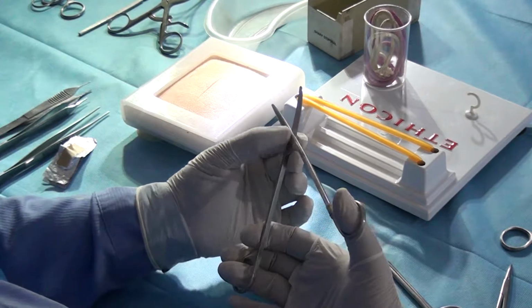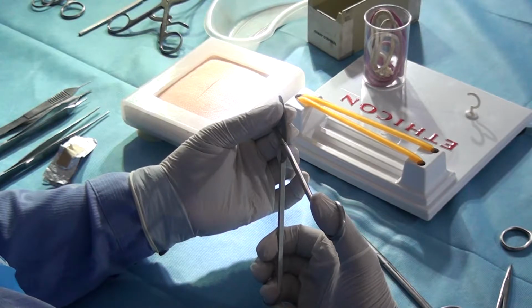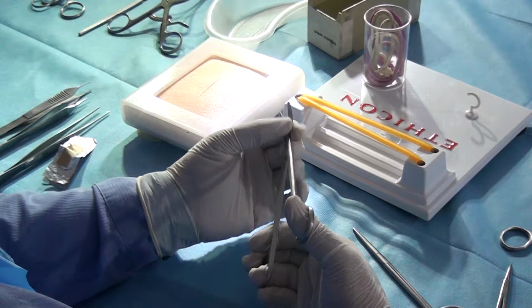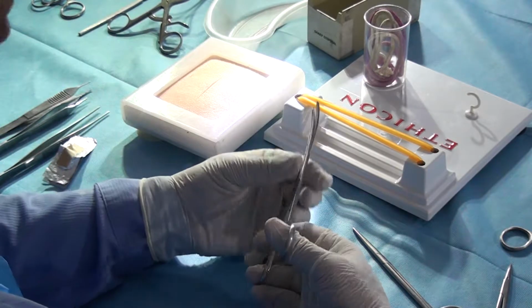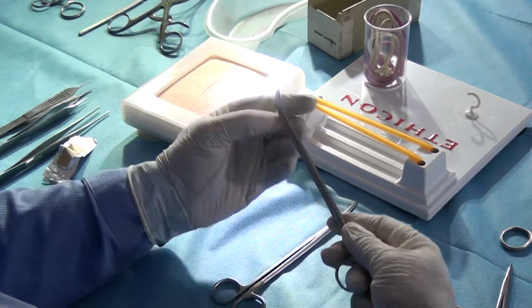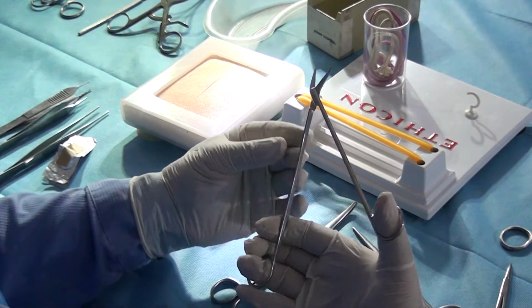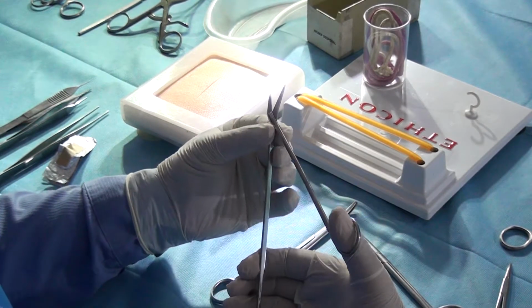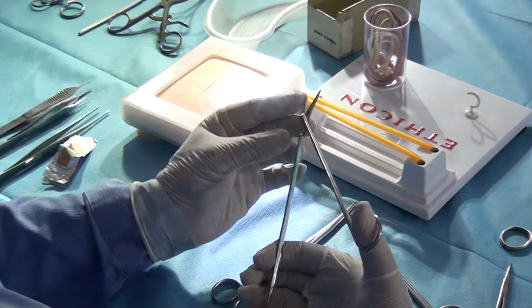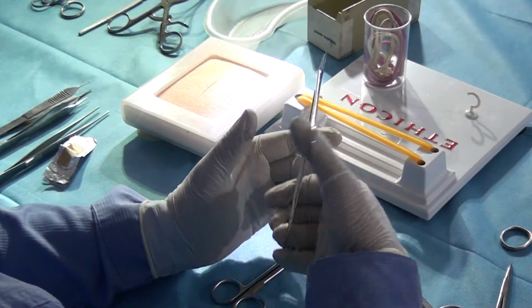If I want to make the scissors more precise, I'll take the fulcrum further up. That's the physics of cutting. If the fulcrum is close to the tip, your cutting would be very, very precise. There is a scissors here, which you can see. It has got a very long shaft and a very short blade. Actually, ridiculously long handle. You can say that a lot of steel has been wasted.